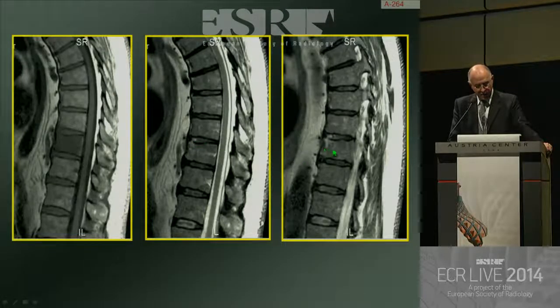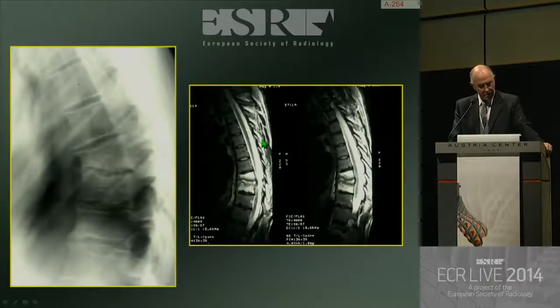And if you look at the same process with intravenous gadolinium, you'll see that the contrast of the vertebral edematous marrow has now more or less equilibrated with the levels above, which are normal, and it shows you the area of infection spreading to the end plate destruction into the disc. So this is a very nice example to, I hope, make you accept that this is a vertebritis with secondary spread.